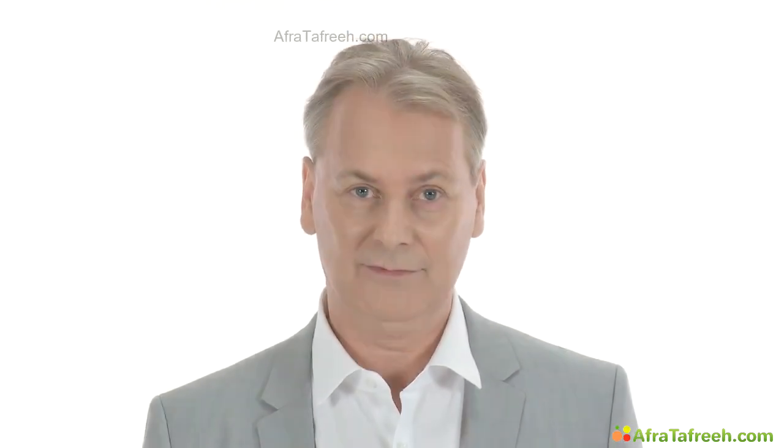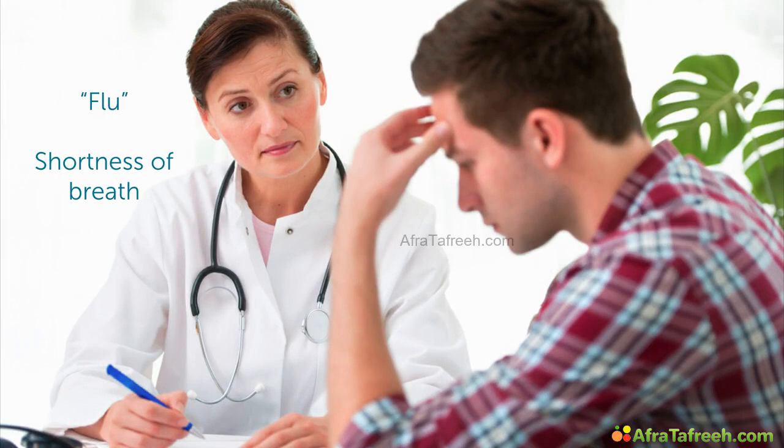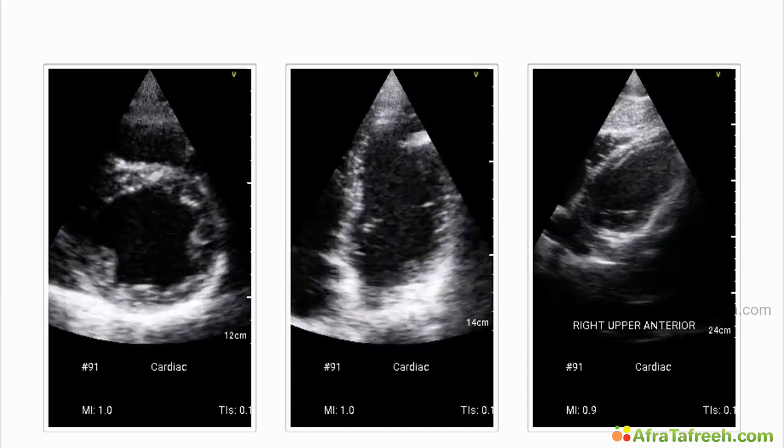and of course, you will rule out some other pathologies of the heart that this patient could have. A 28-year-old comes to your office and complains of shortness of breath. He's kind of worried because his father just recently died because he had coronary artery disease and heart failure. Now he had symptoms of a flu and is worried that he has myocarditis and heart failure as well. So you perform an echocardiogram, and what can you tell the patient immediately?